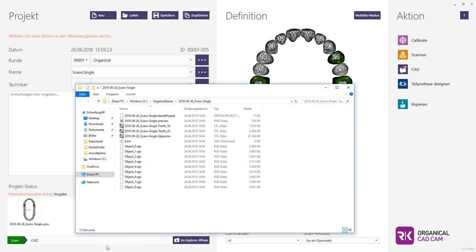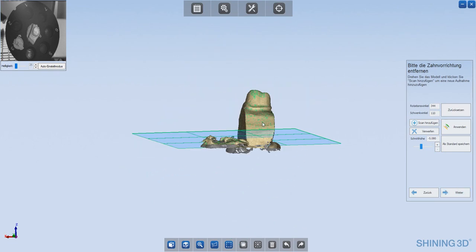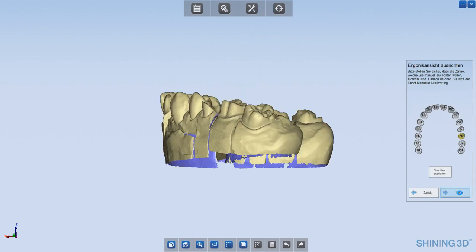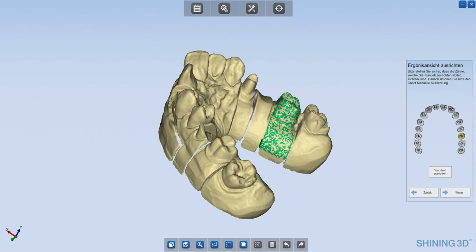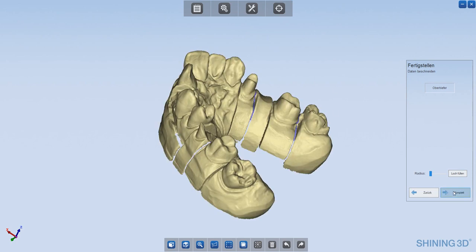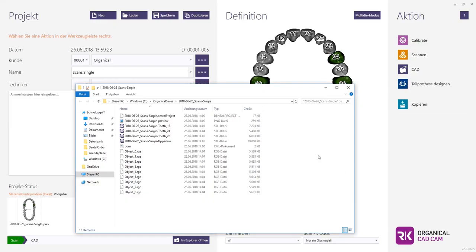We had problems once, just in the training. When I do my training, I think about too many things and don't concentrate so much. And I made a mistake with the upper and lower jaw. So I wanted to make a bite splint at the lower jaw, and I put the wrong one. I put the upper when he said put the other one. So, first of all, let's finish this one. Then I explain how I change the scan for the upper and lower jaw.